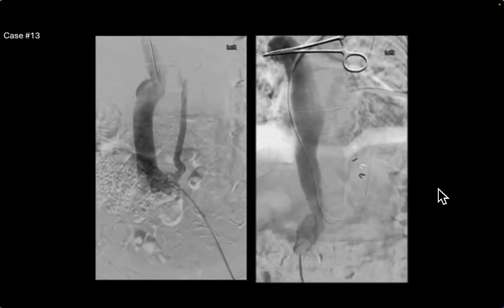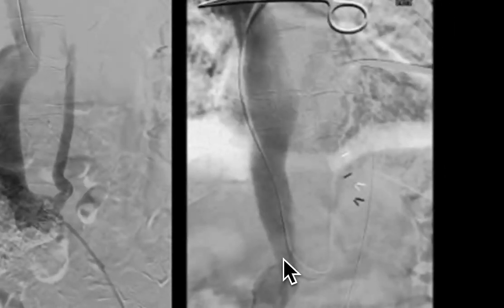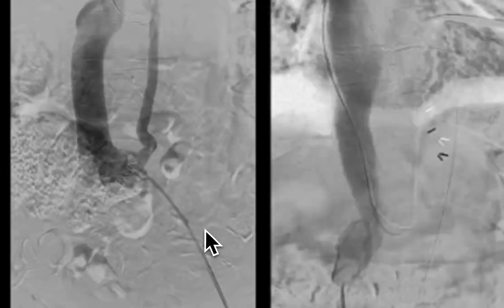All right, case 13, we're continuing with our caval variants. Tell me what you see here and what's going on. It can be a little tough. So this is going to be an injection at the level of, here's the diaphragm and here's the heart. So we're injecting a structure up here, and we see that there's this tubular structure going cranially that then drains into the heart superiorly. So remember, in a normal cava, what you would expect is it comes up into the right atrium and drains here. So we're injecting a structure that's going behind everything and then continuing downwards into the abdomen.